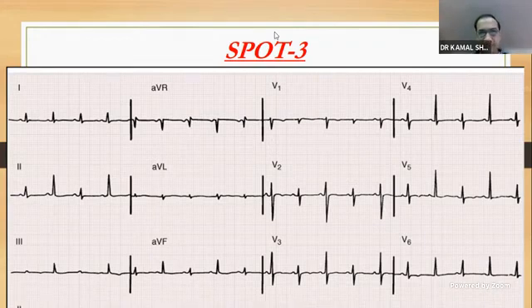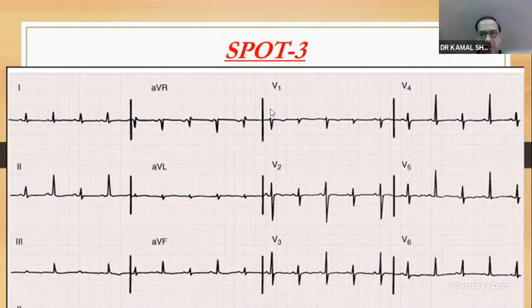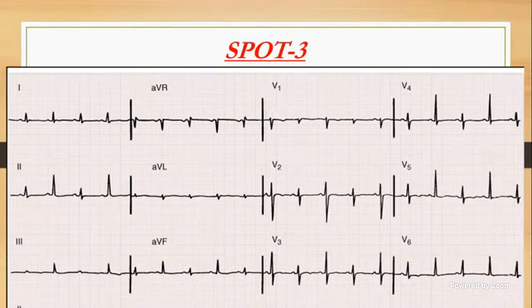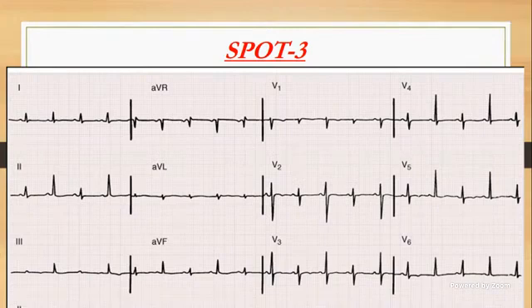What's the problem? Imran has already answered. What is it? QRS alternans is there. Electrical alternans. So what are the causes? Cardiac tamponade, sir. Pericardial effusion, large pericardial effusion with suspected cardiac tamponade. Now remember, that's the MD level question. Yes, sir. Now what becomes the DM level question?